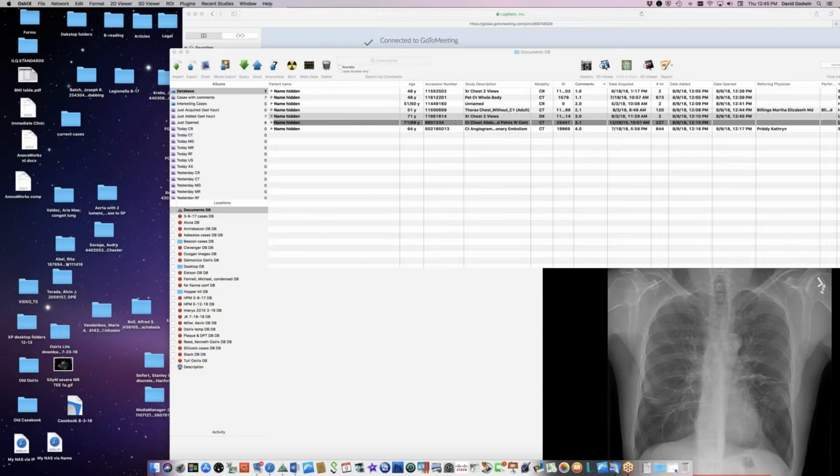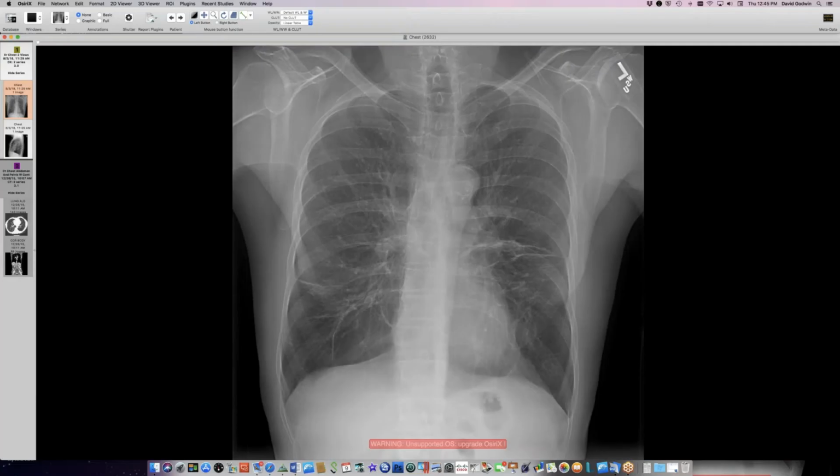That's what I would think of too, yeah. Okay, guys, by committee, it's definitely LIP. Okay. And then this person has basal predominant emphysema, is a cigarette smoker, but was also a Ritalin user. So when I saw this, I thought alpha-1 or Ritalin.